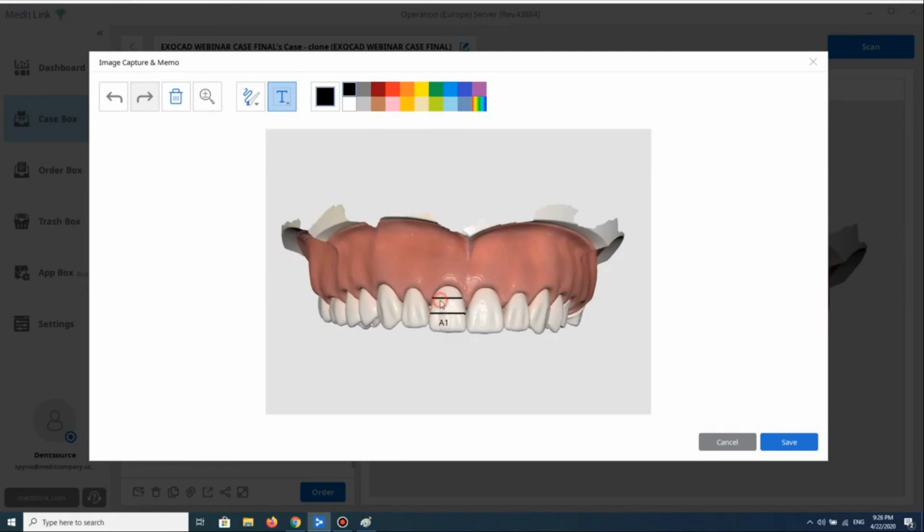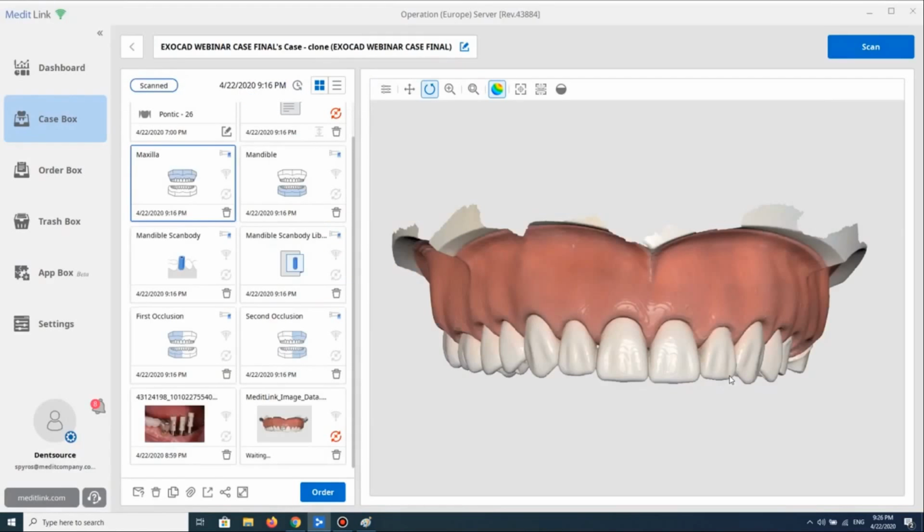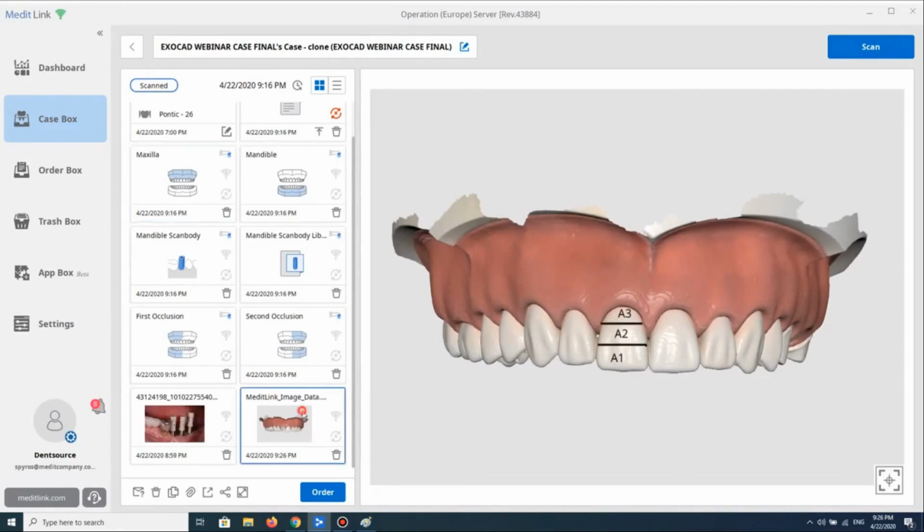Yes, that's also another amazing feature that you can do. So your lab will know what you prefer in a multi-layer. And here you are. Of course, you can do the same. I click save, and now this data will be generated and saved in my case folder. So if I press here, you will see it. Okay?